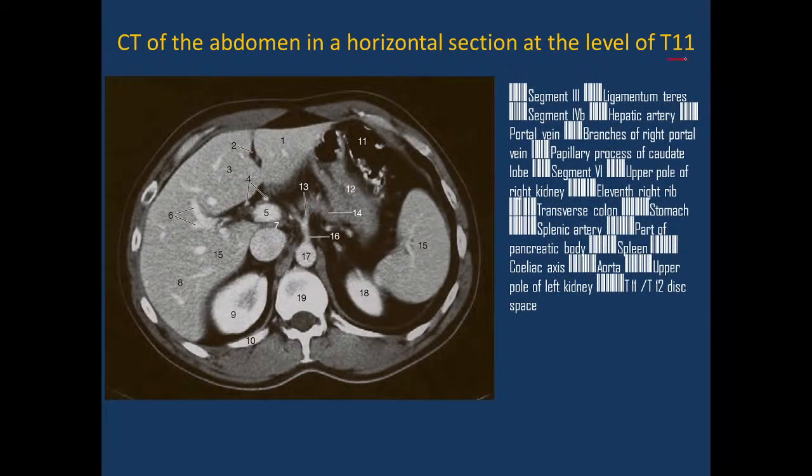This is the level of thoracic 11. The same organs, but you also see the kidneys, right and left.